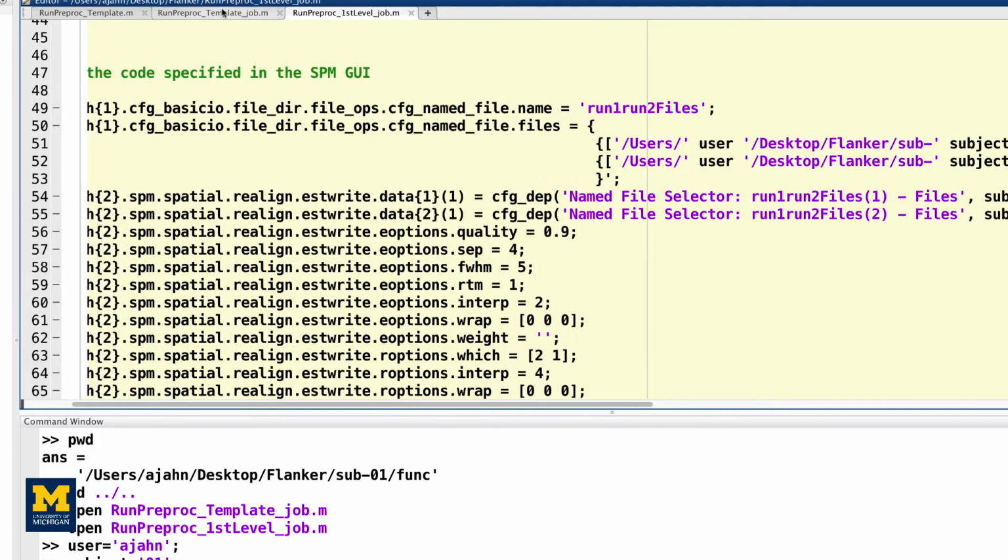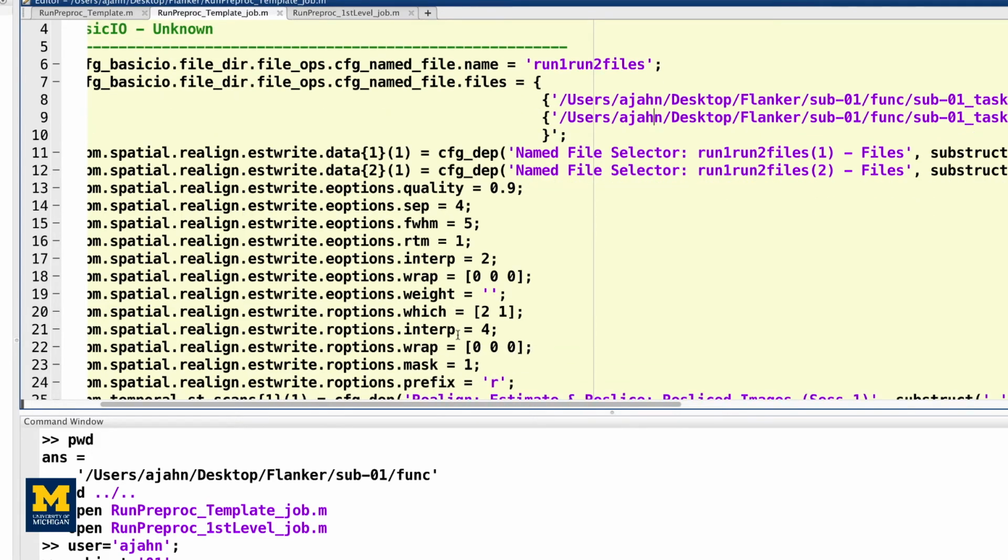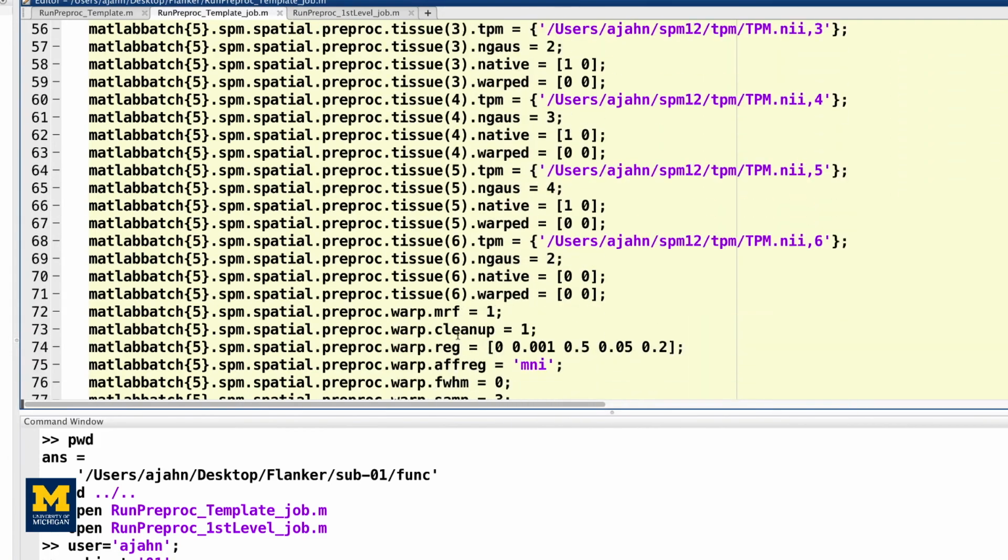The last part of the script we have to edit is the onset times. In this experiment, each subject had different onset times for each condition. If you already used the script in the previous chapters to convert the timing files, then you can create a variable that contains the timing information and insert it into the onset fields in the stats module.